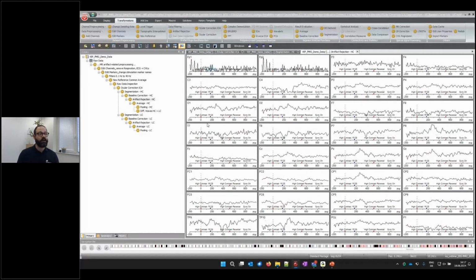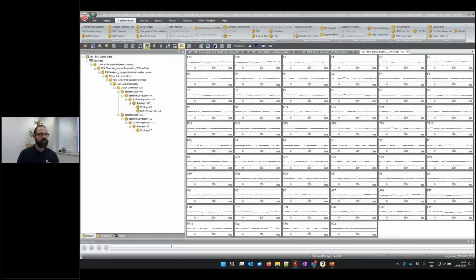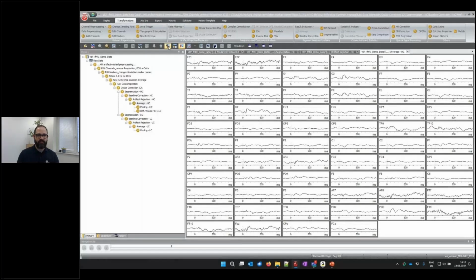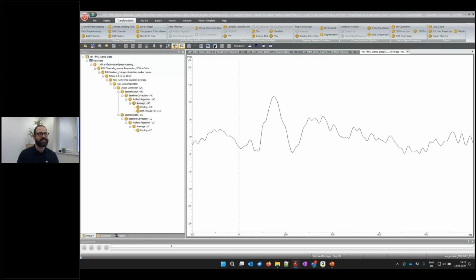Okay, then we have our ERP. I just want to show you once. Let's look at all channels. For instance, I'm grabbing this one out because there's a pretty large deflection, PO8. In a posterior electrode, we have a rather big deflection around 100 milliseconds, so in an area where we would expect something visual to happen.